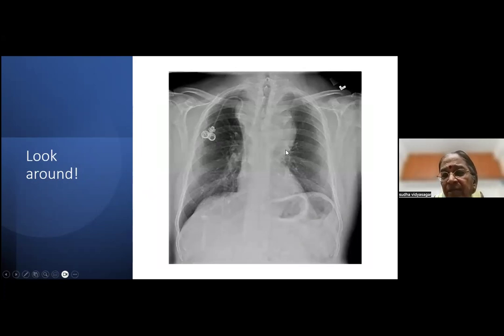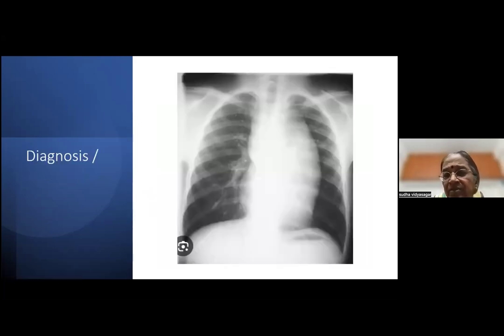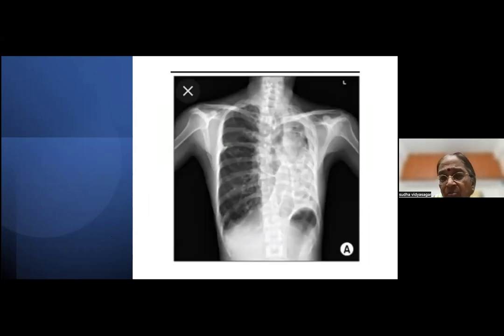Okay, that's another mediastinal widening that I'm showing you here. It's a bilateral thing. Again, you have to apply the same rules, that you have to think of any of these conditions. That's another mediastinal widening. Again, a big one, coming on both sides. Could be a lymphoma, could be anything else also. Doesn't look like a bronchogenic carcinoma because it's on both sides.